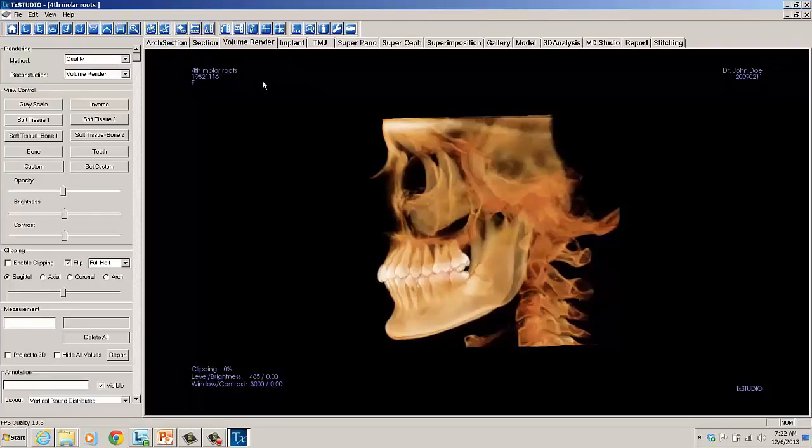Let's talk about capturing images now. Before capturing images, you may want to remove the cursors in the volume renderer and the volume renderer window informational text. How you do that is at the toolbar we will see an eye, and we can click on that and it will remove the text on the screen. That might be helpful whenever we're printing out or saving an image.